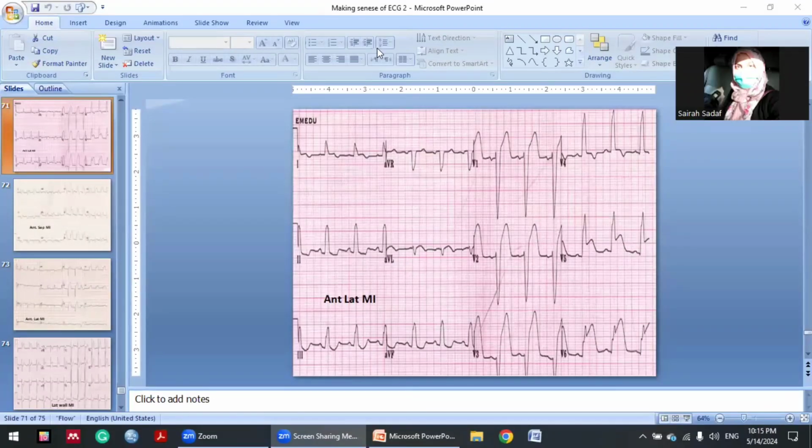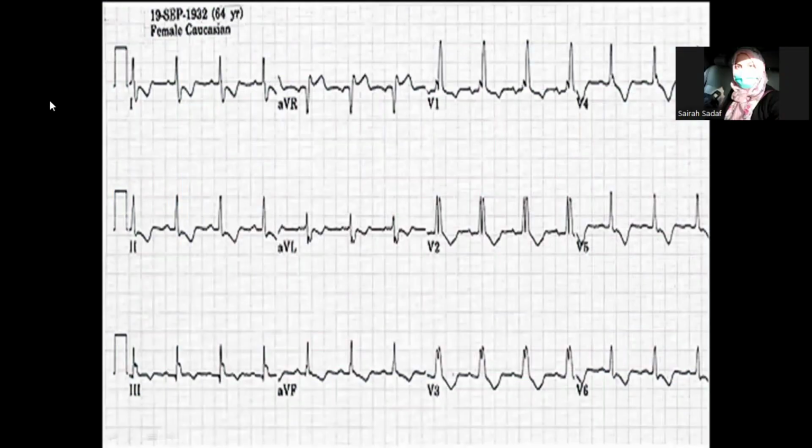Ali, what are you asking? I have lost your question in all the rush of these comments. What are you asking? In bundle branch block, do we have to check only V1 and V6? I have already answered this. This is a beautiful ECG of RBBB. Now, how can I say this is RBBB? You have to answer this. Let me open the mic for you. Now you can talk. Ali, just unmute yourself and talk to me.